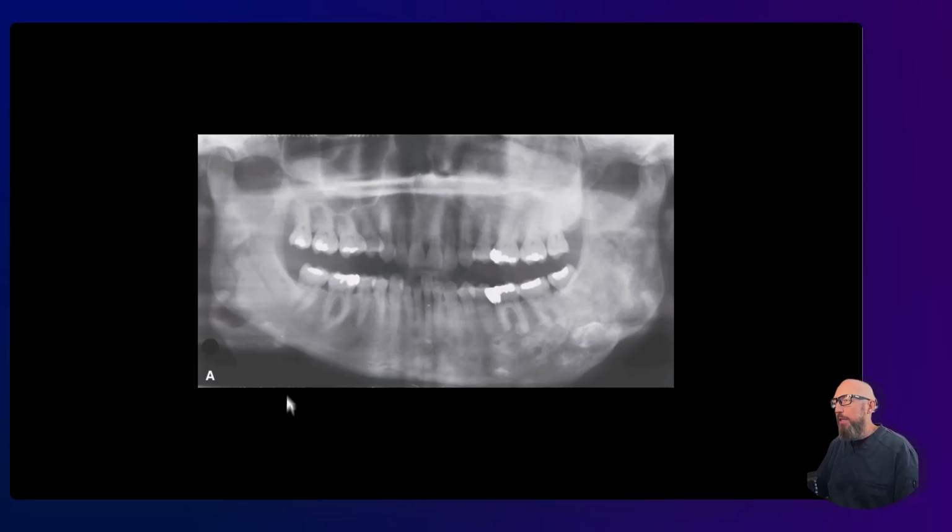And now this one, do you appreciate where it is compared to the last? Actually, it looks like 2 locations. I see something going on in the maxilla as well as the mandible. Contrast that with the previous image, and is it well-defined, ball-shaped expansion, radiolucent rim around it like an ossifying fibroma? No, this is more gradual. It's expanding but following the shape of bone. This is more your fibrous dysplasia.